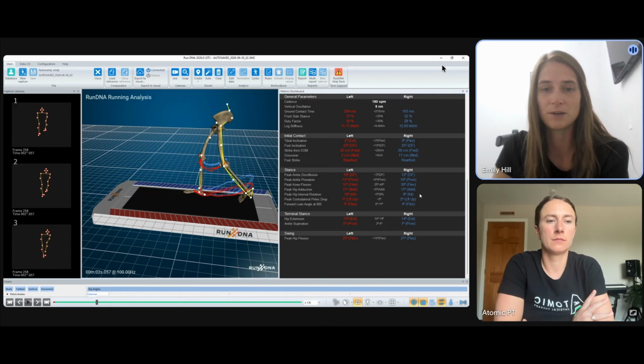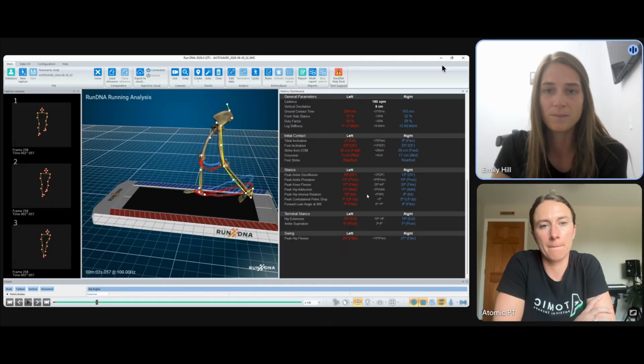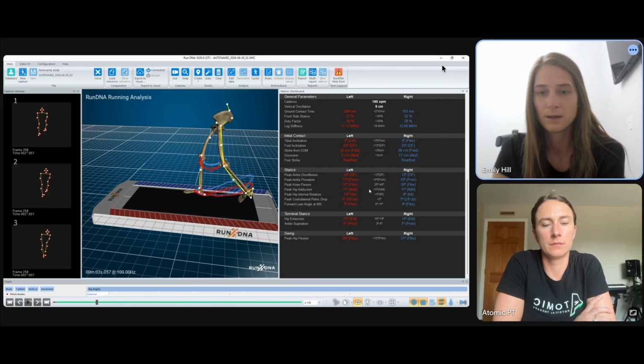So that would be something we definitely want to keep an eye on because, like we talked about with the high foot inclination, if you have a high foot inclination angle and you combine that with poor hip control, that's going to increase your risk for having more injuries at the knee specifically, showing up as that runner's knee sort of injury.